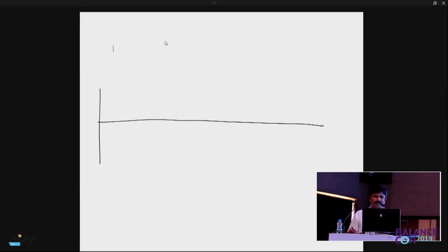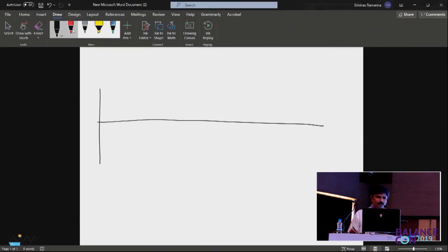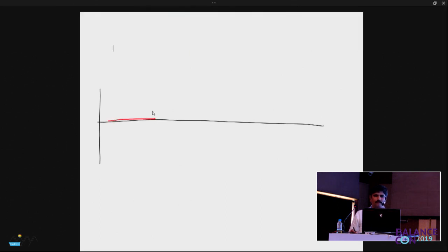Now, what is the meaning of this one? The eye is stable or not moving and looking right in the center. Is that right? Now, what does this mean? Now the eye went to the right side. Now it is looking on the right side. Now it went left. Here it is looking to the left.